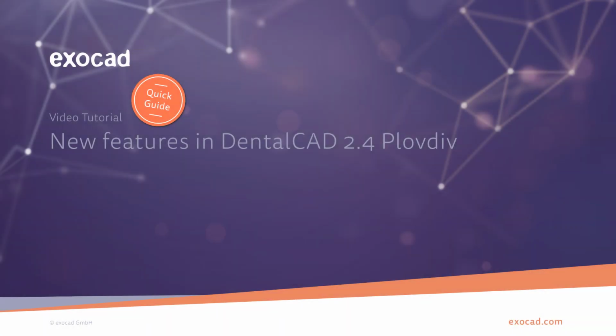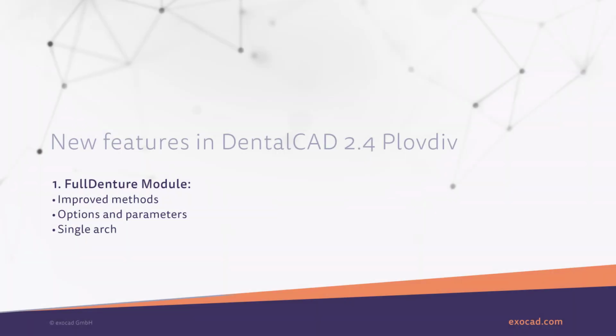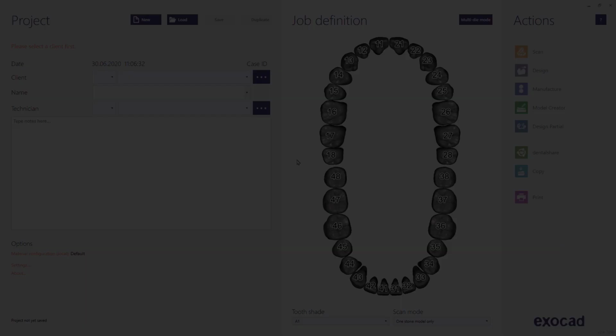This video tutorial from exocad will show you some of the new features from exocad's latest release, Plovdiv version 2.4. The Plovdiv release includes more than 64 new features, as well as 45 enhancements to existing functionalities, with the main focus on advanced removable design.